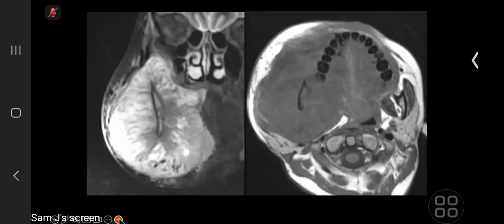Then moving on to the MR, this is the post-contrast T1 weighted imaging. You can see avid enhancement with the periosteal reaction involving the bone marrow, and almost extending into the supra and infratemporal fossa. And there is significant destruction of the angle of the mandible on the right side, also going into the hard palate region. So the final diagnosis is gnathic osteogenic sarcoma.